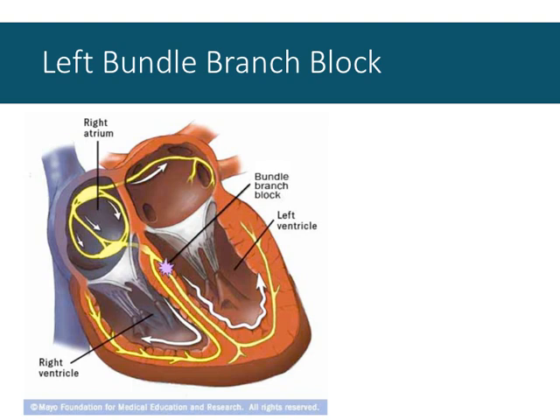So the only way for the signal to propagate through the rest of the left ventricle is for it to circumvent the blockage or transmit through the tissue itself. And it often will result in what we see as a bimodal QRS complex. Not P wave, not at all a P wave.